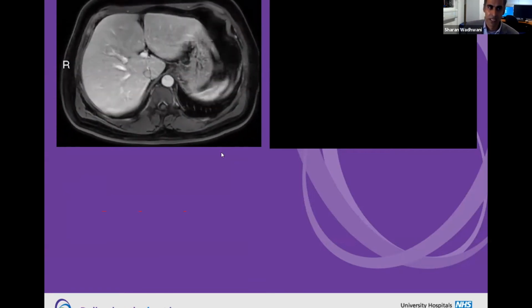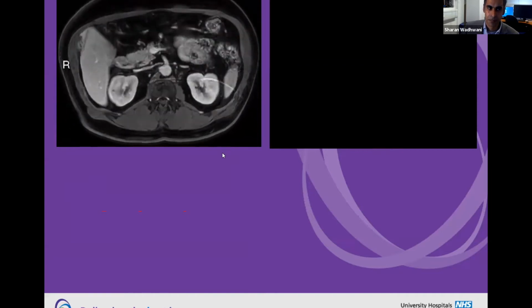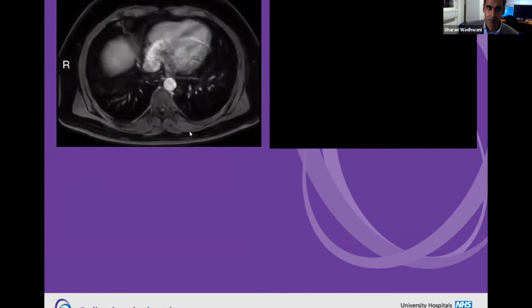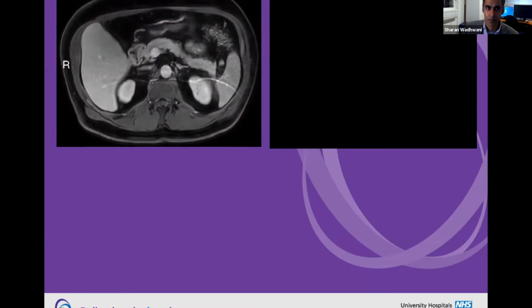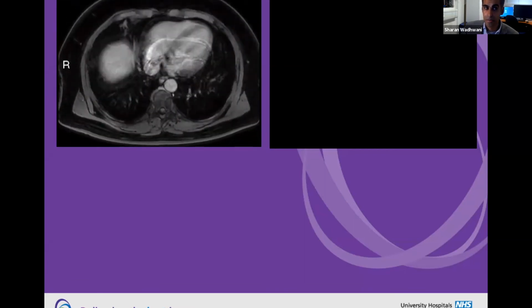Okay, portal venous phase. Okay, late phase. And I'm still not seeing anything there.